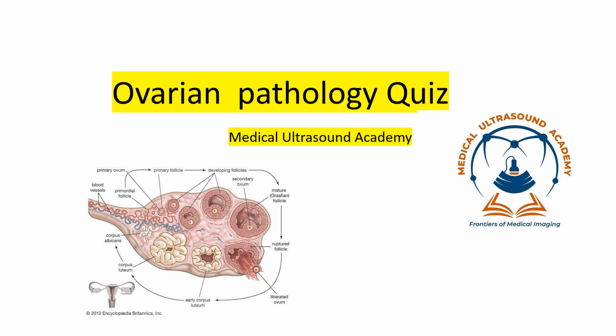Medical ultrasound is the greatest gift from God to mankind, but sometimes making the right diagnosis poses a dilemma. So let's unpack the sonographic dilemmas that we can find during our examinations. So here I'm going to explain the answers to our ovarian pathology quiz session that we've done.